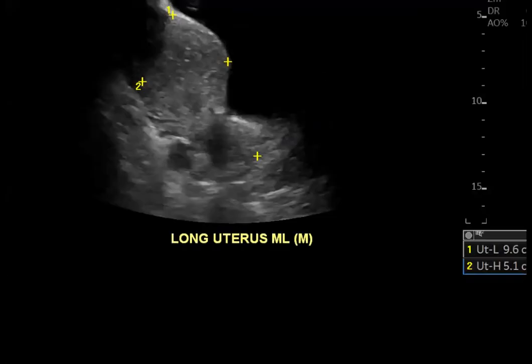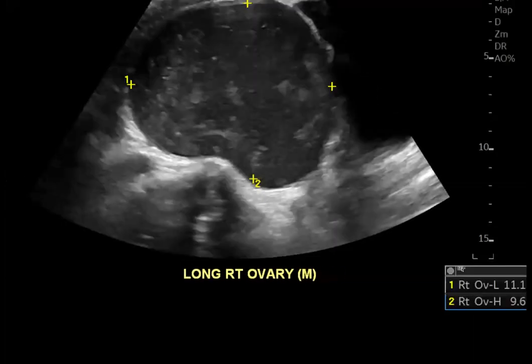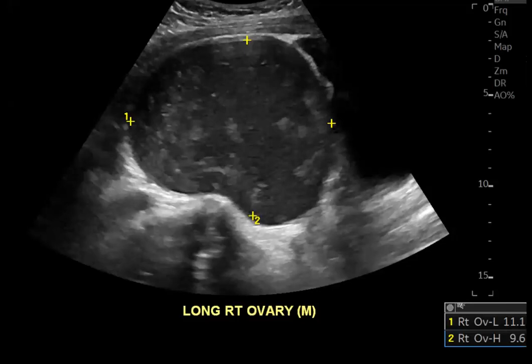With the large endometrioma, transvag. Yes, right there. Okay. So, you were describing how the various features of dermoids one can see with echogenic areas, the whole thing may be echogenic and shadowing. So one feature that is described in endometriomas is echogenic nodular deposits or nodular tissue along the walls, like we see here. And literature describes these as cholesterol crystals, giving rise to those echogenic nodules within an endometrioma.